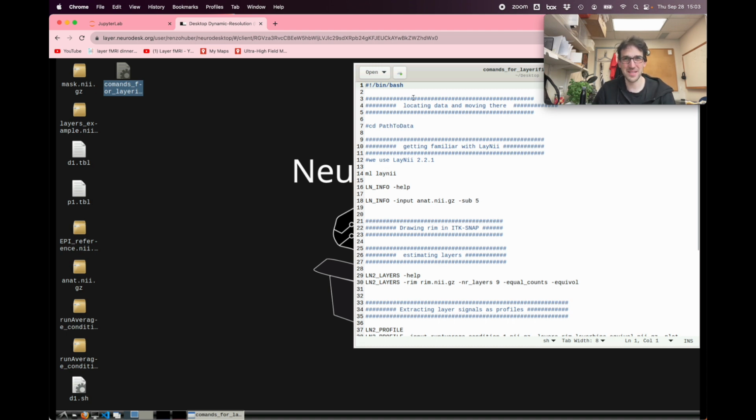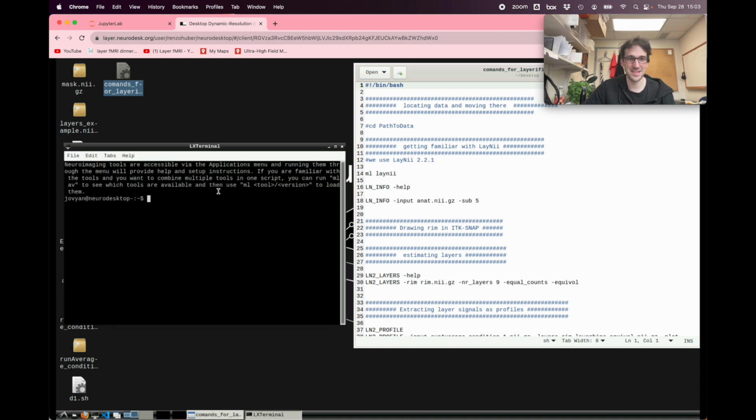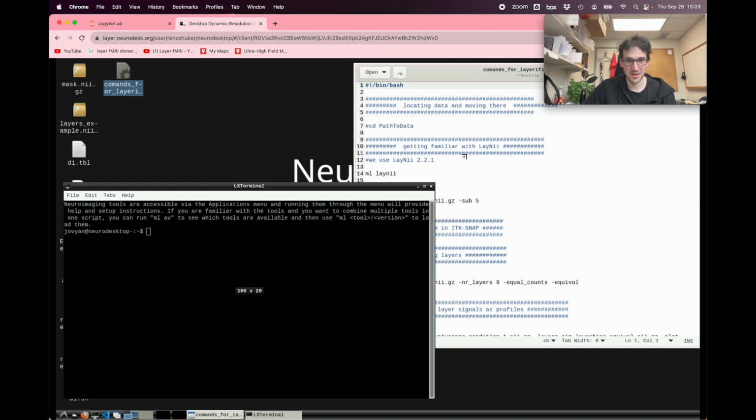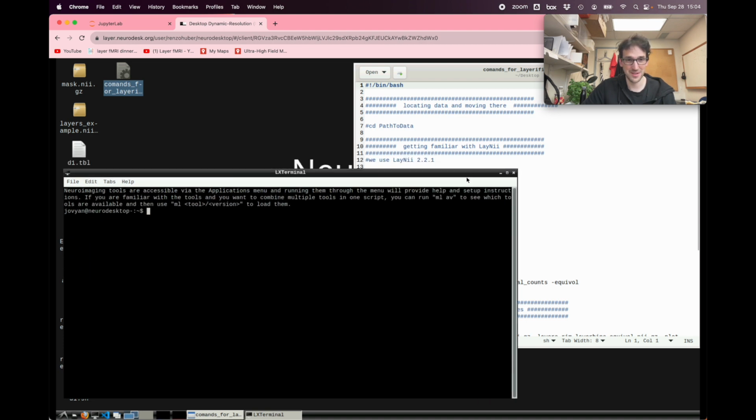And based on the biosketches that I saw from people that registered, it looks like most of you should have some level of experience with using a terminal. So down here you see this black screen. Let's click on that. That's our terminal now. And we can type stuff in here, and I make it a bit bigger. You can do this too if you like or not.